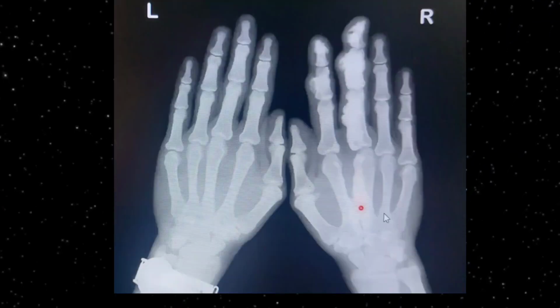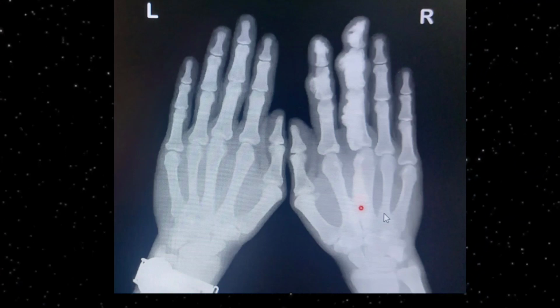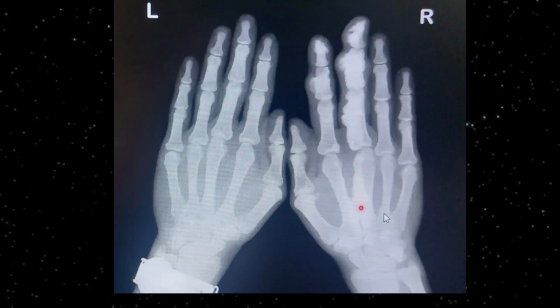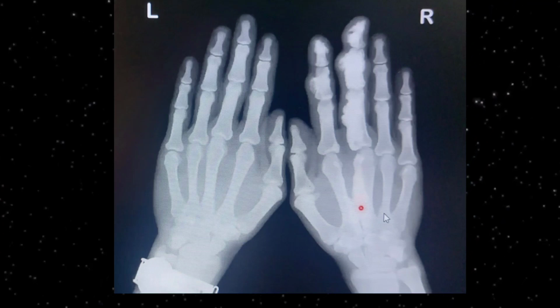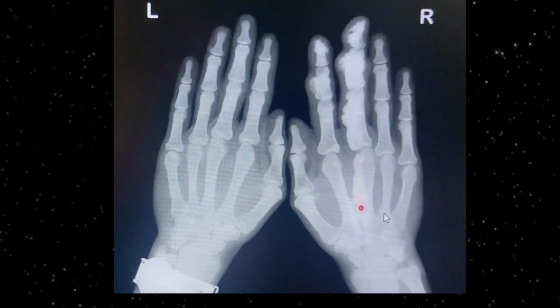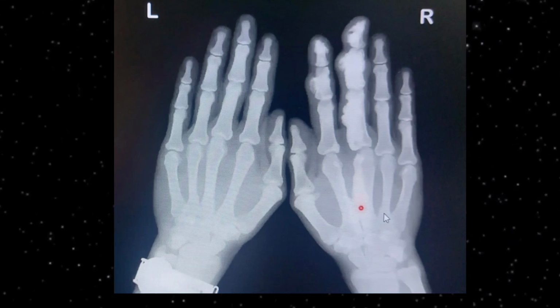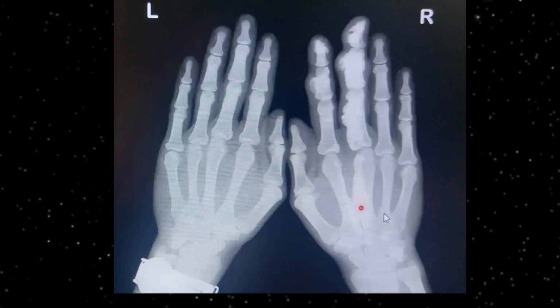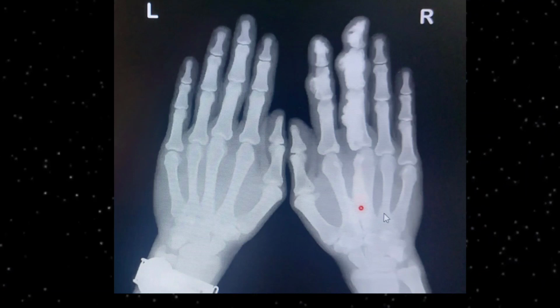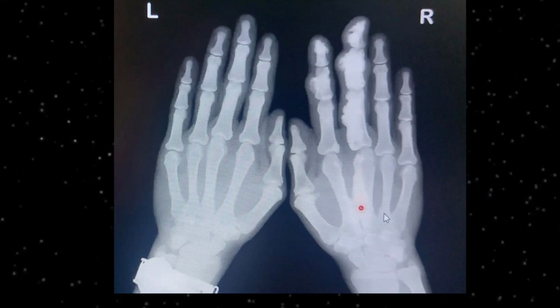This radiograph beautifully explains the hyperostosis and sclerosis involving the distal phalanges, the interphalangeal joint area, and the proximal phalanx as well. You can appreciate the particular dripping candle wax appearance, and as I told you, it may involve a single bone, or sometimes multiple bones in a single extremity. The left hand is quite normal, and the pathology can be appreciated on the right side. This is the dripping candle wax appearance.